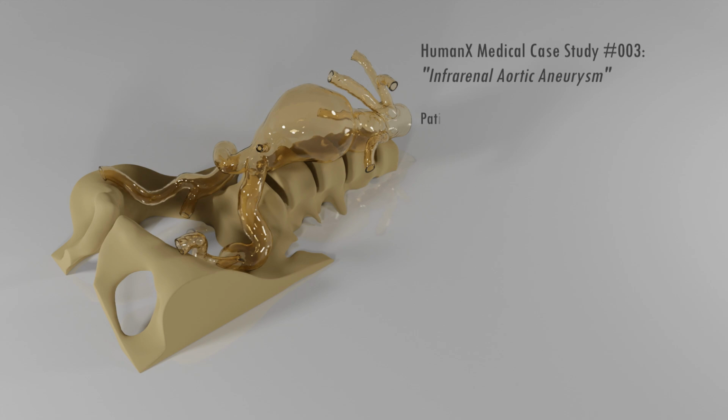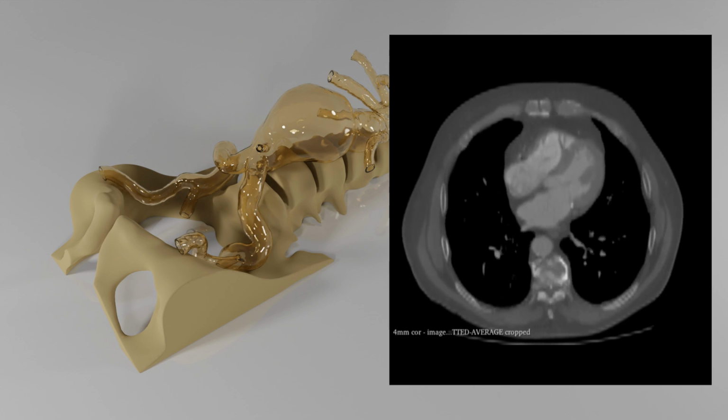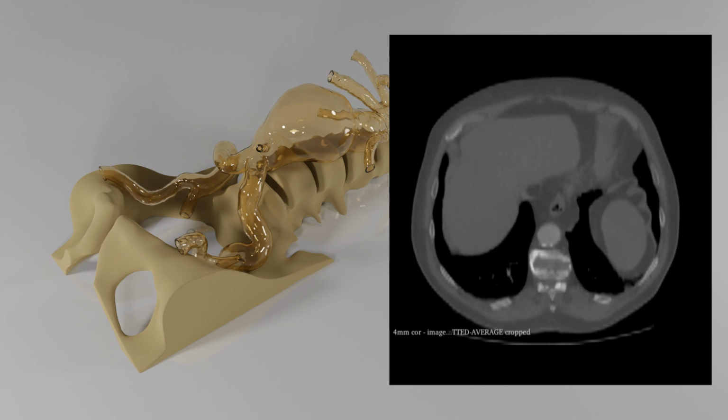I'm Caroline, and in this video, I'm going to show you how we helped a patient and his surgeon to better understand a specific pathological situation prior to an endovascular intervention. The CT scan for the case was provided by a Vascular Center 2 weeks prior to the planned intervention.